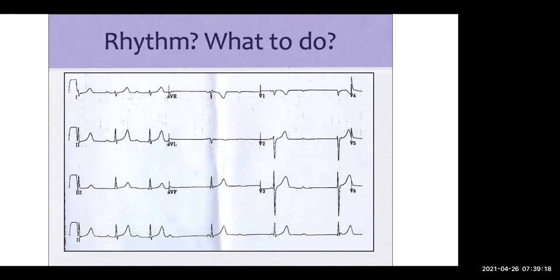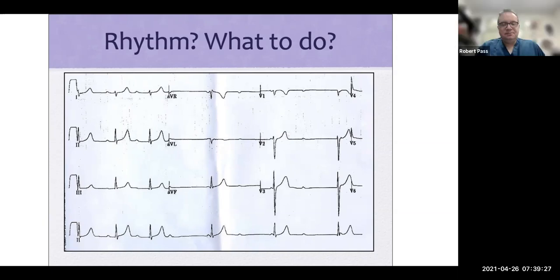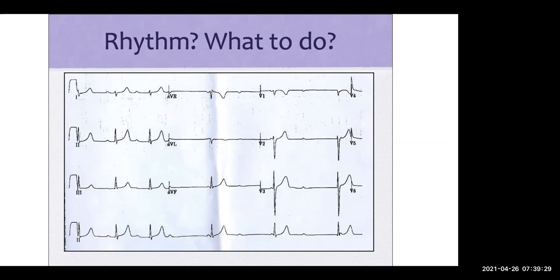Well, the first part of this second lead looks like it's Mobitz 1, I mean. But then the second part of this lead looks like it's not.